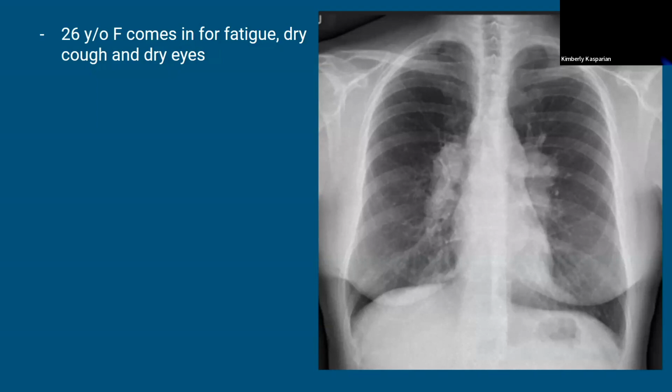E, everything else. So she's got what seems to be bulky hilar lymphadenopathy. You've got these bulky little lumps sitting right next to the great vessels. No clear infiltrate. You've got lung margins all the way out to the periphery. So, young, dry mucous membranes, I think about scleroderma, lupus, or Sjogren's, or sarcoid. There it is. All right, that's gift card worthy. You were right on it.